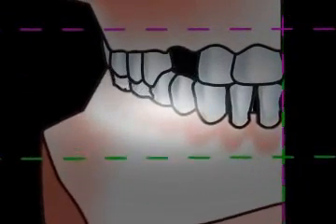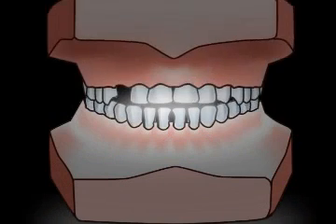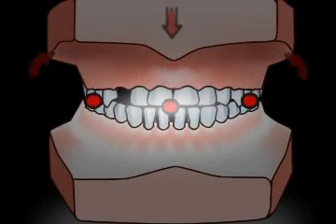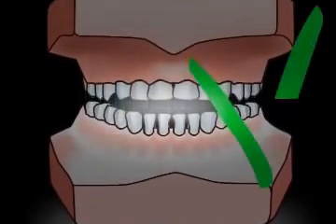The dental prosthesis, shown here in blue, can't be shaped precisely. A full impression yields complete jaw models, and thus a so-called three-point contact. Therefore, the models cannot be swiveled. It is only then that the technician is able to produce an exact-fitting dental prosthesis.